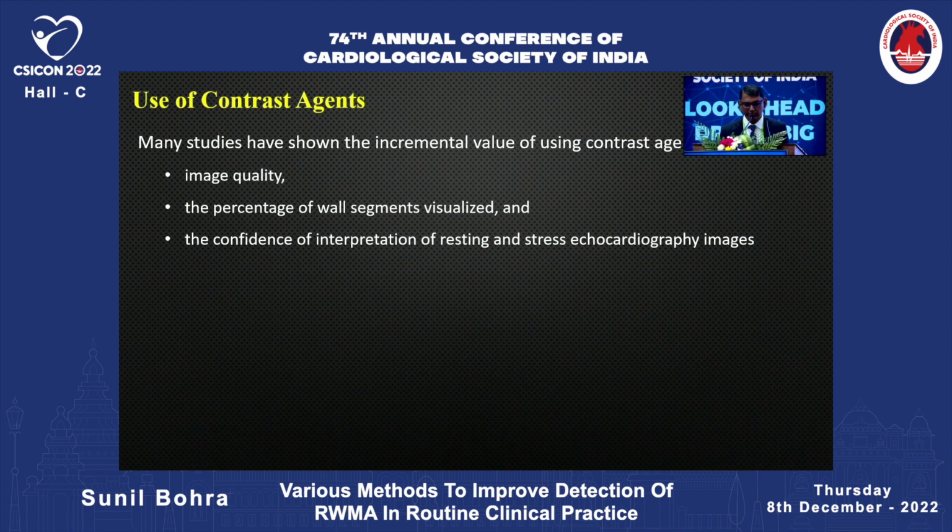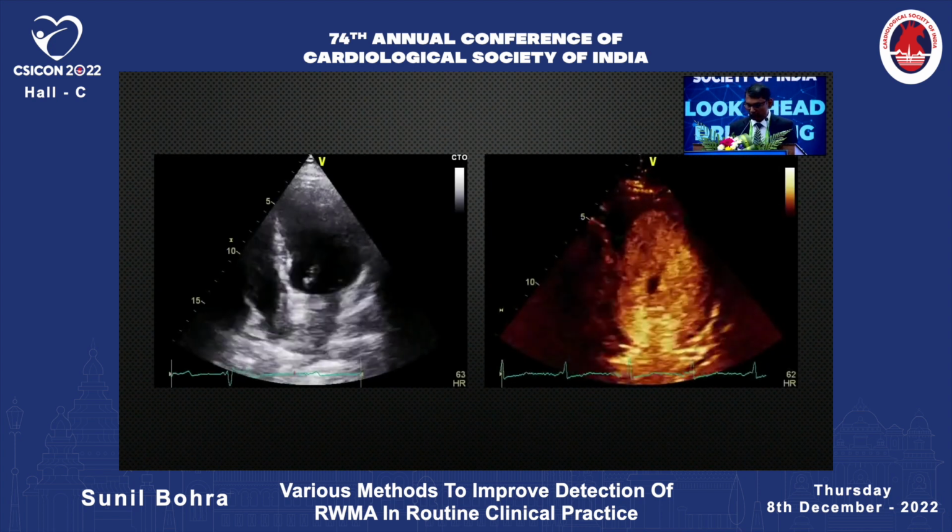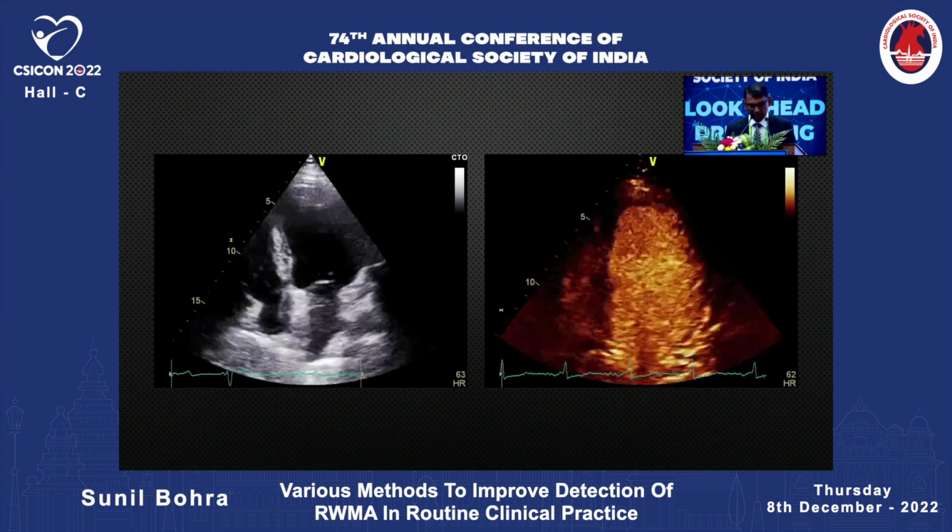So many studies have shown an incremental value of using contrast agents to improve the image quality, the percentage of wall segments visualized, the confidence of interpretation of resting and stressed echocardiography images. These are a few of the examples which are there in this left side image.